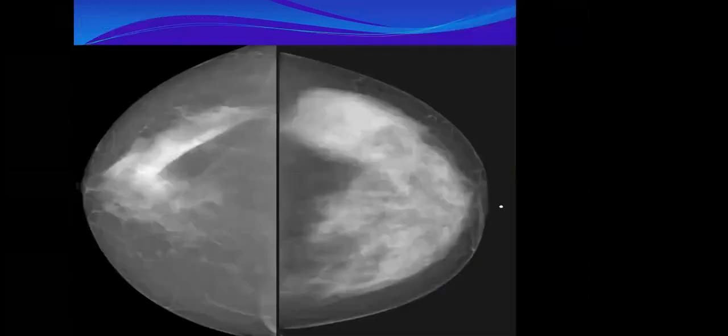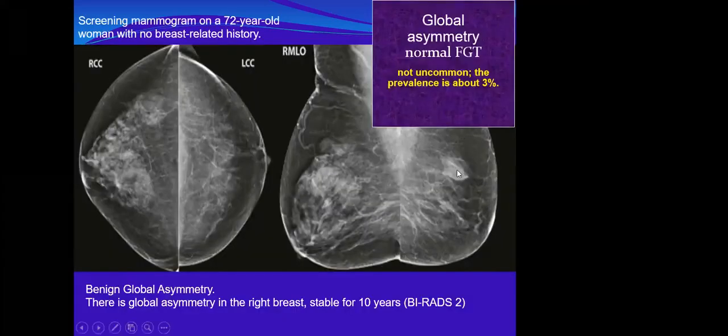And this is my patient, I have shown to you last session. Dr. Abab, what about the left breast in the previous case? This one, yes? This area? Asymmetry. Yeah, it seemed to be here, but it may or may not be a real asymmetry. You see, in the other view, it doesn't show. But the more impressive one is the global asymmetry. I have seen it, but they did not mention it. This is a SER case.